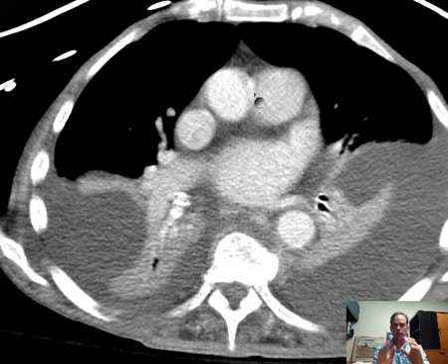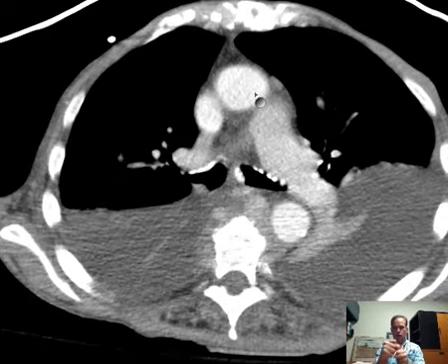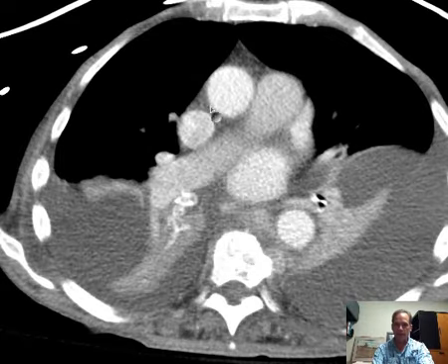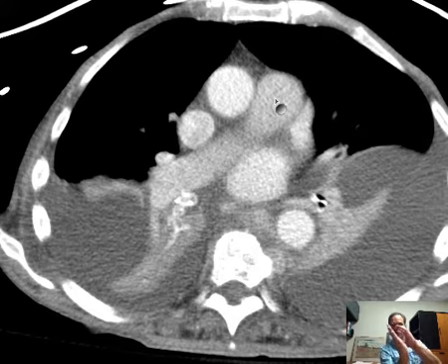But as you can imagine, in order to create this effect, where they swing around relative to one another, that septation that divided the main artery into aorta and pulmonary artery came in here and then made a division like that. So it's not just a straight division, it had a twist to it.